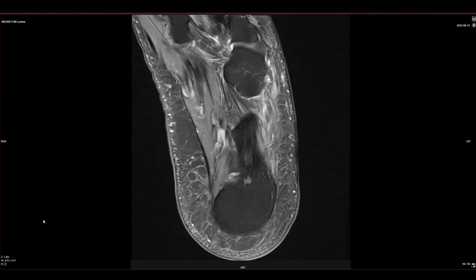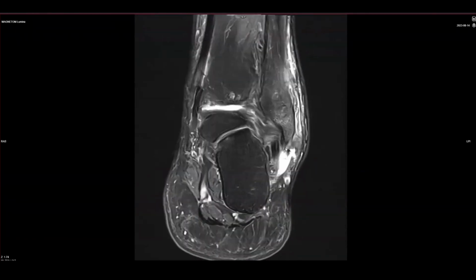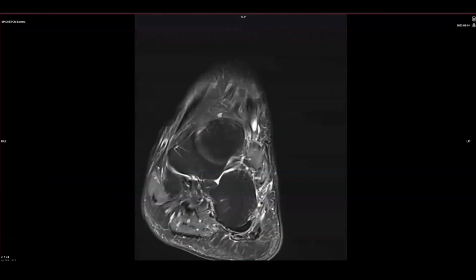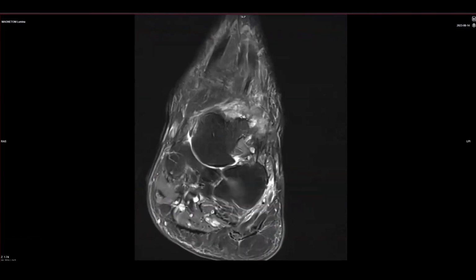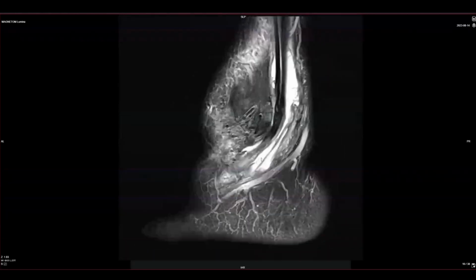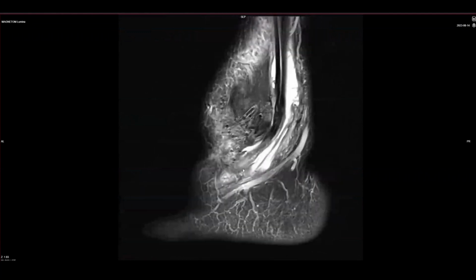And one thing we can do here is look at this coronally. So let's try to see, this is the longus, this is the brevis, this is another piece of the brevis. And what we're seeing is the tendon then comes back to have those interstitial high-grade distal tears again, a little worse than it was before. Now when I look sagittally at this tendon, I might even be able to appreciate how thin this brevis looks now, or how irregular it looks. There's less fibers here. Probably some of it has retracted to this level.